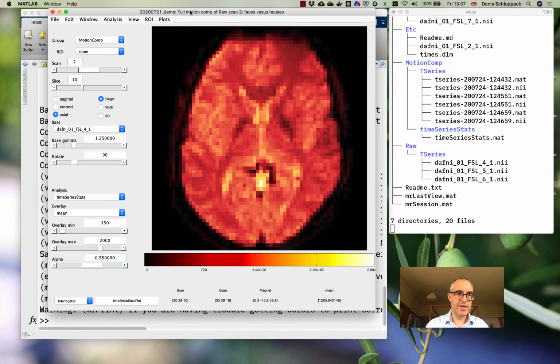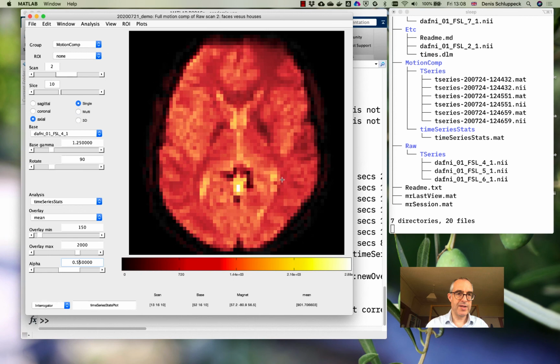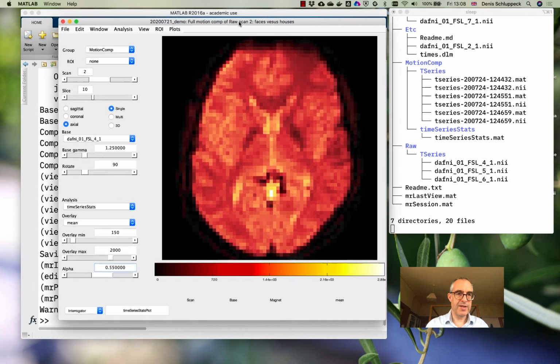The next step is to manipulate some of the data and some of these intermediate results we got by actually looking at them from a scripting point of view, maybe from inside a function. To illustrate that, I will introduce this idea of how we can access data that's stored in this combination of files on disk and metadata inside various data structures. And this brings me to this idea of views of the data. In the next segment of this video, I will explain this a little bit more.